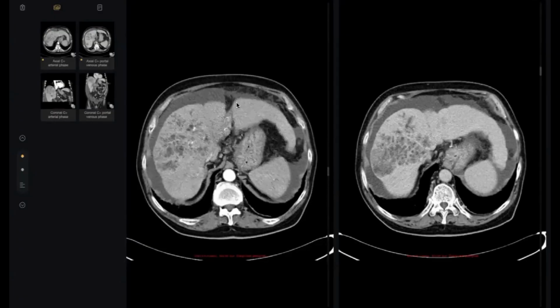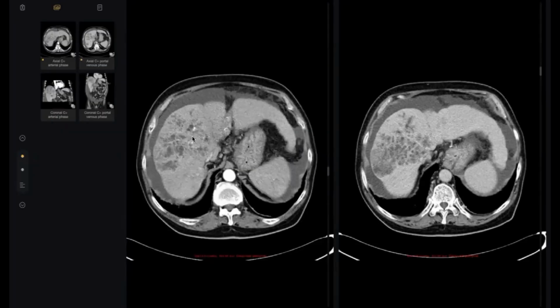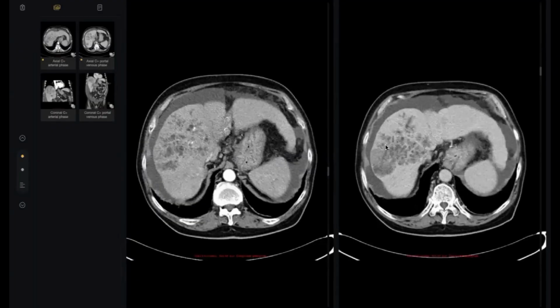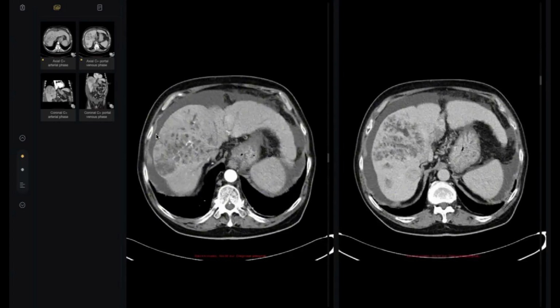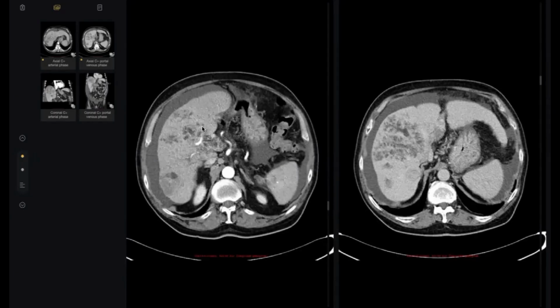Doctor, are you sure? If this is intrahepatic biliary duct dilatation, it should be cholangiocarcinoma. Could you expect cholangiocarcinoma to cause convexity or retraction? No, it causes retraction. Here I can see that the liver surface appears irregular and nodular. So this is the starting point: you should start by telling the examiner this is a cirrhotic liver, and then we start to describe this one. What do you think this is? I think maybe this is a lesion which contains multiple cystic and necrotic areas.